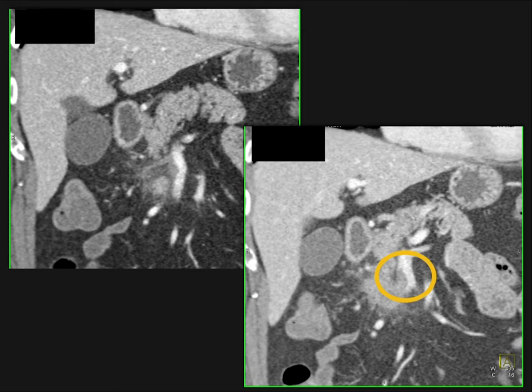Again, I always am careful with biopsies. I've seen many times the biopsy say adenoma, it's really neuroendocrine. I know what the pathologist says, but then I dictate what I think. And sometimes I dictate, like there was a case a couple of weeks ago, I said, it's probably not adenocarcinoma, though that was the prelim, and it ended up being an acinar. It just didn't look like an adenocarcinoma the way it enhanced.